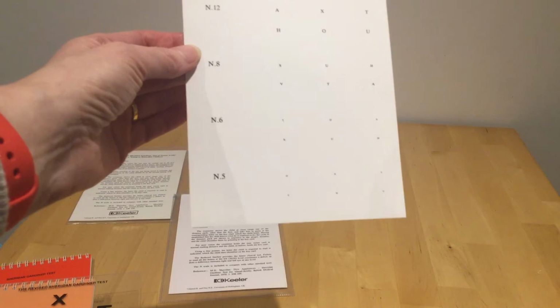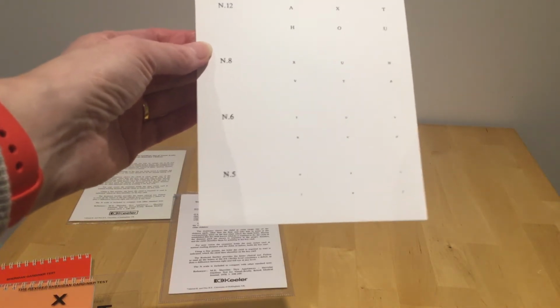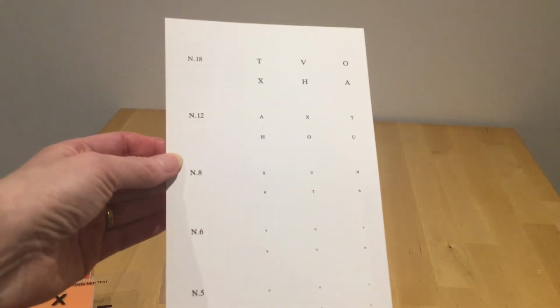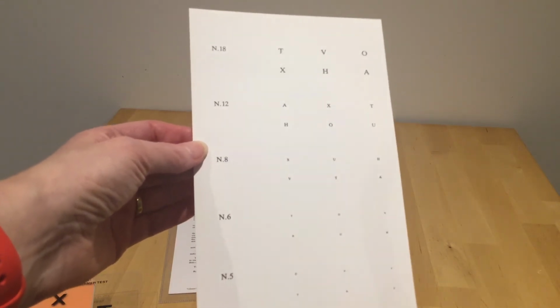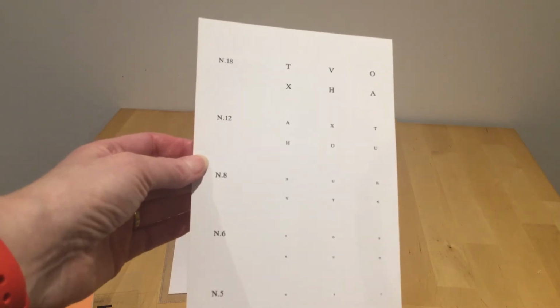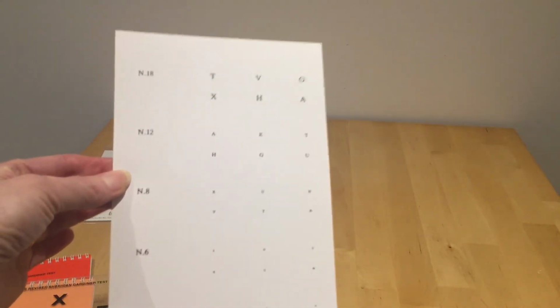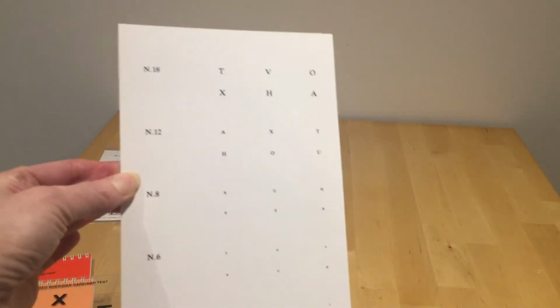The child could go as close as they wanted to see it, but obviously it's quite limited in terms of what it's assessing, because it doesn't have the full range that you would get in McClure, for example, which is crowded as well. So I think fairly limited, but something to show you, just to make you aware that it does exist.